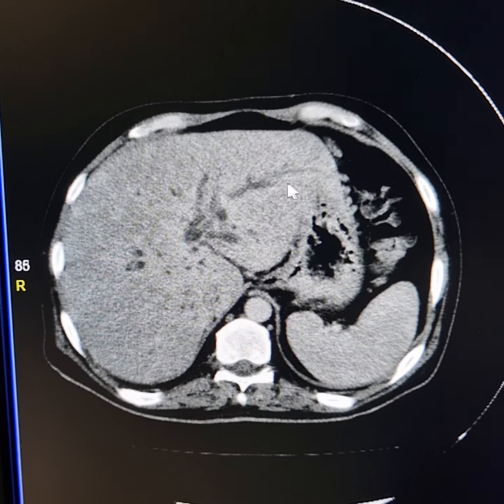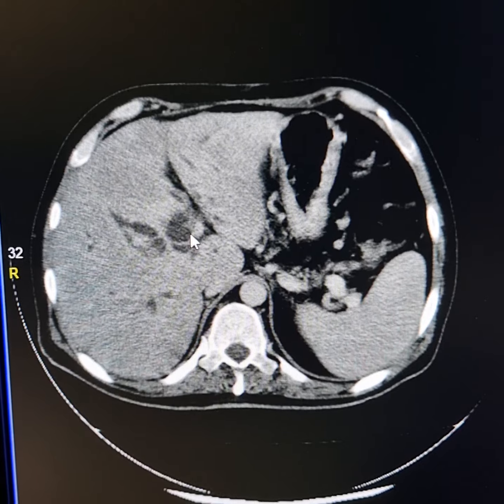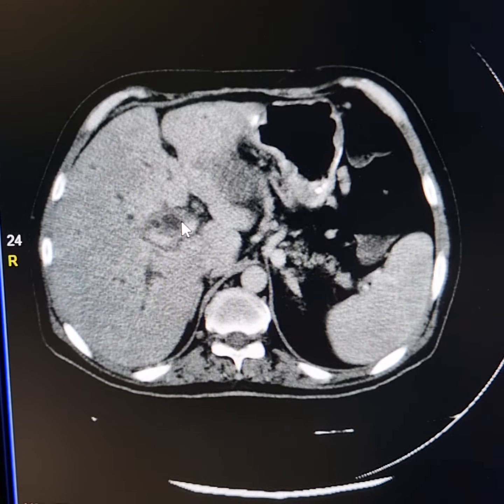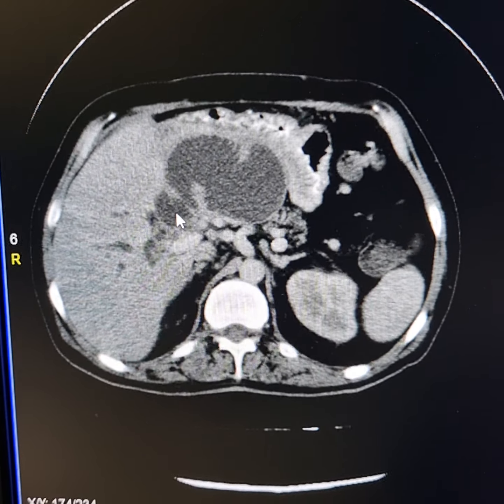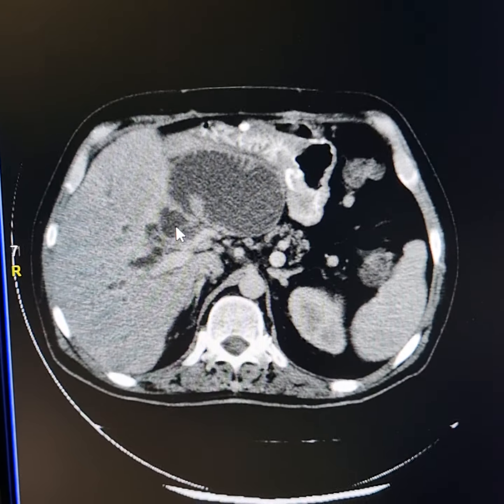Now there is mild dilatation of intrahepatic biliary channels. Please trace it down. This is the site of confluence of both the hepatic ducts. This is the common hepatic duct, which is dilated. Please trace it down. Just see that this is opening into this dilated gut segment. This one. I trace it back up again.